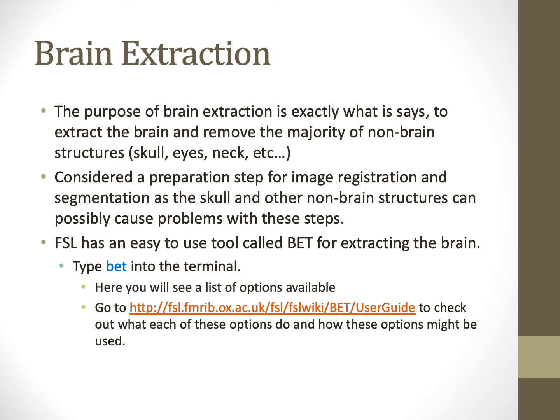FSL has a very easy tool to use called BET, for extracting the brain. Type BET into the terminal. Here you will see a list of different options that are available. Also, the FSL wiki and user guide provides extensive information about how to use the BET tool. Check that out if you would like to see how each of these options and how they might be used.